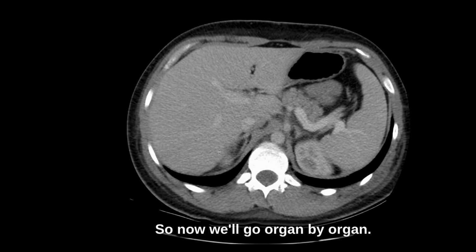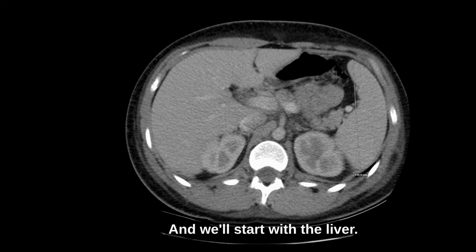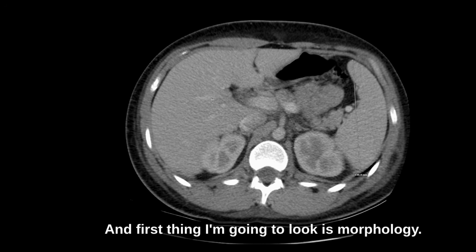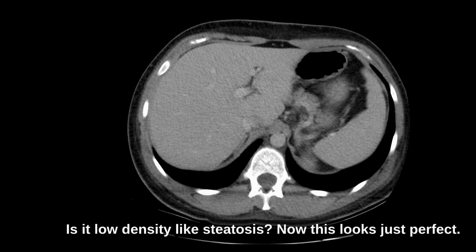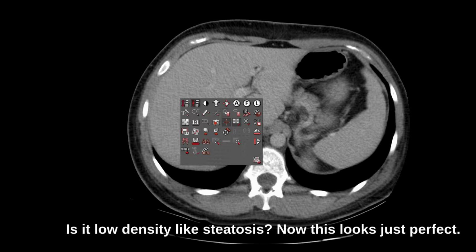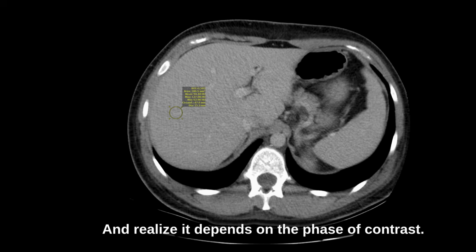That's good. So now we'll go organ by organ, and we'll start with the liver. The first thing I look at is morphology. Is it cirrhotic or not? Then density. Is it low density, like steatosis? Now this looks just perfect. Usually the liver is about 100 Hounsfield units. And realize it depends on the phase of contrast.